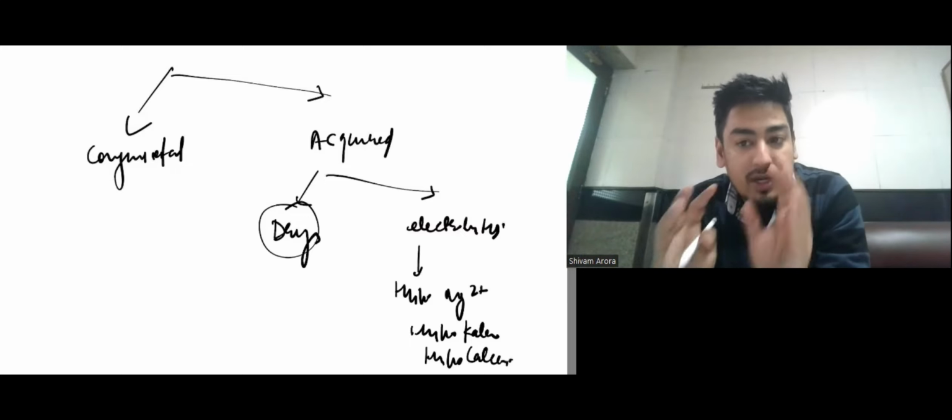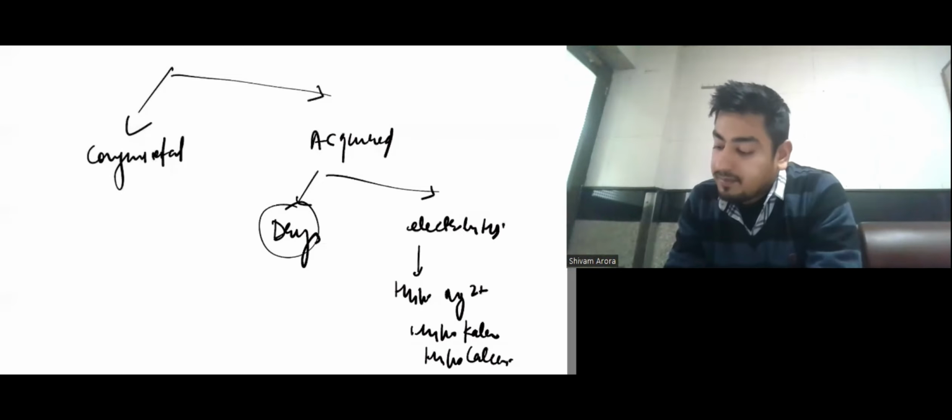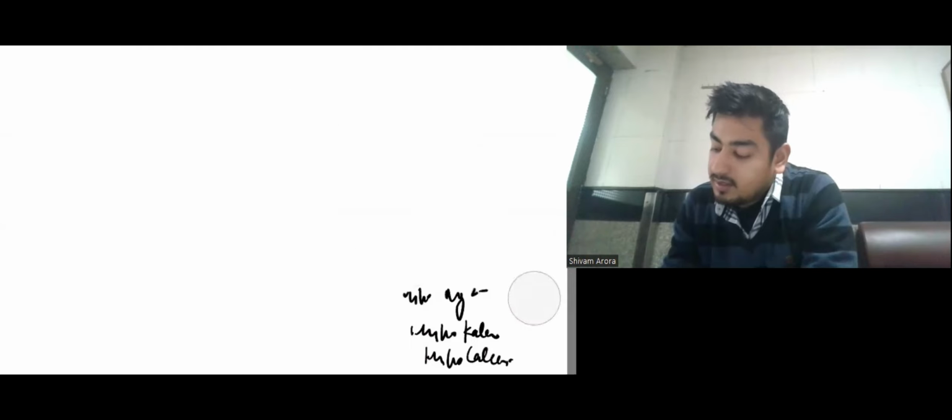Okay. Now you'll tell me in the comment section which three drugs can cause prolonged QT. So multiple drugs can cause prolonged QT, but you have to tell me at least three drugs. Okay. Now after that we'll discuss T waves.